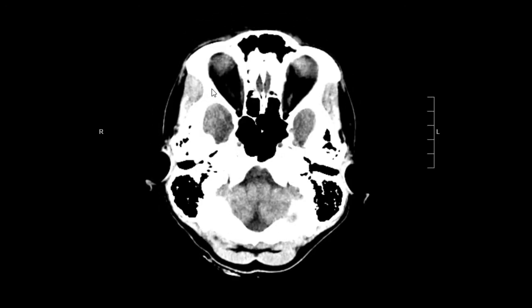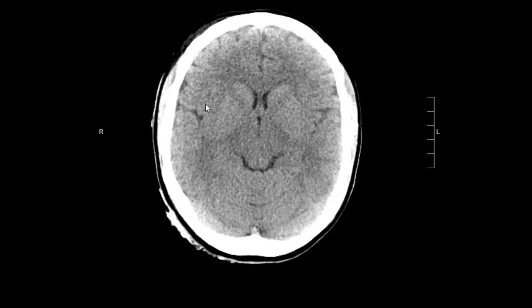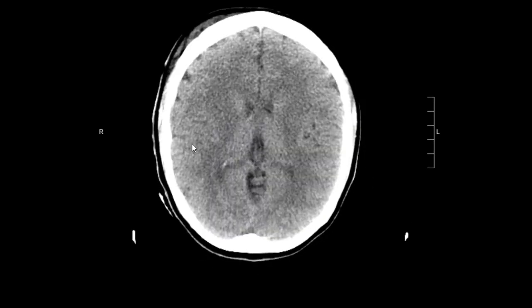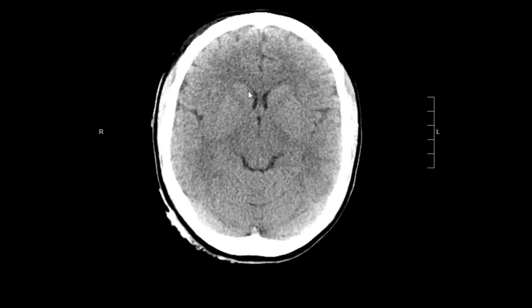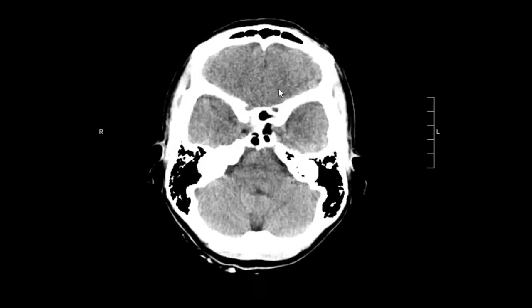The main things would be a stroke, and also in traumatic cases you can look for evidence of a specific type of injury known as diffuse axonal injury. And so here we're looking along the gray-white matter junctions, evaluating the basal ganglia as well. Here you can see the caudate, your putamen, your globus pallidus, and your thalamus. And I can see all of them well.